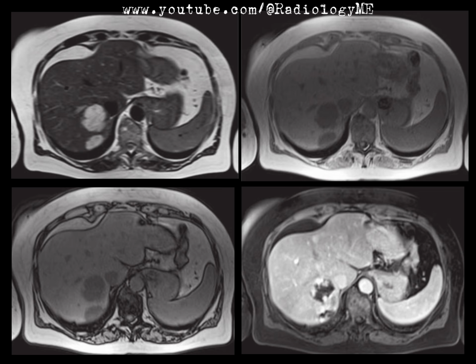For instance, if these lesions were found in an older patient with a background of chronic liver disease, especially hepatitis, we might consider hepatoma. However, in this case, given the lack of cirrhosis or any other risk factors, a benign diagnosis seems much more plausible. If the radiological findings were equivocal, further imaging or even biopsy might be considered. But given the classic appearance here, most clinicians would be comfortable with a diagnosis of cavernous hemangiomas, and no further intervention would be required.